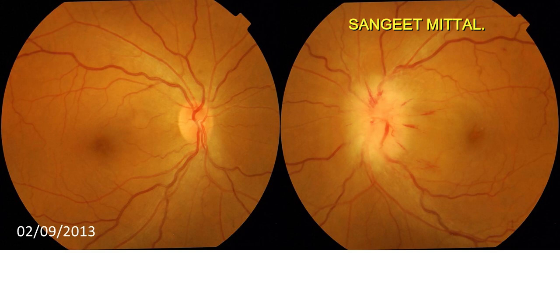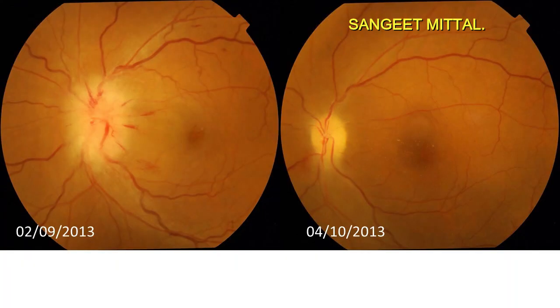This particular case involves a 55-year-old male patient who presented with pale disc edema and was subsequently diagnosed with AION. The patient was initiated on intravenous methylprednisolone pulse therapy. At the 1-month follow-up, there was a notable reduction in optic disc edema, and the patient demonstrated moderate visual improvement.